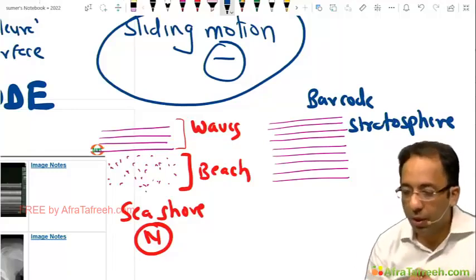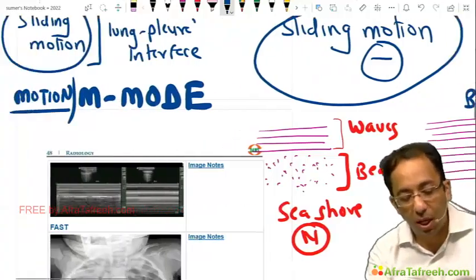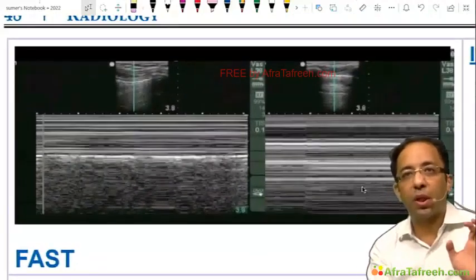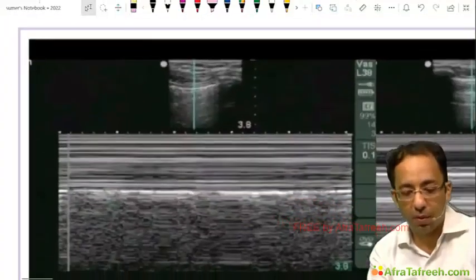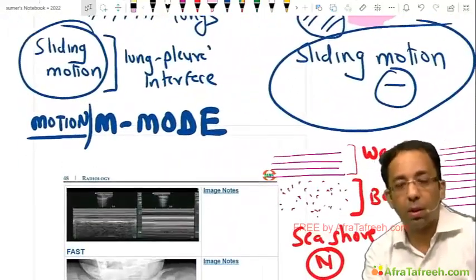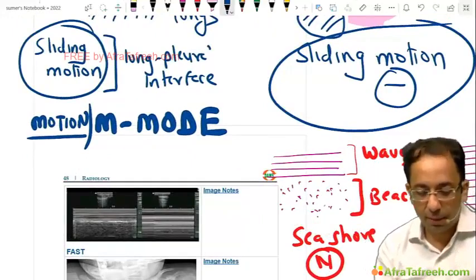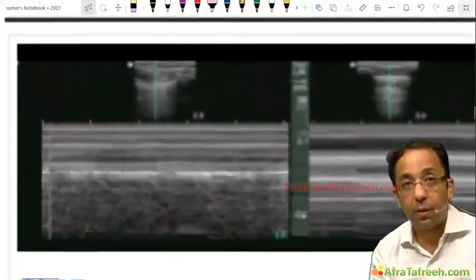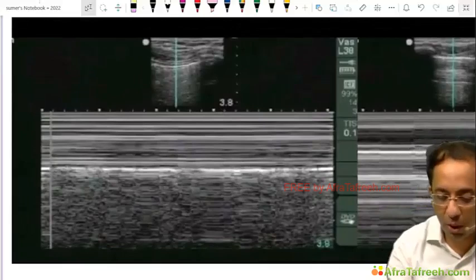Okay. Now this time I will repeat once more for Abhijit and everybody who's asked me. Now I will repeat with a real image, and I want you to know this is a direct question that can be asked multiple times in your exam. Okay, please see the first image, beta. I will try to zoom it. I think it's already zoomed. Just give me 1 second. I'm just getting the system to respond to the high resolution image.